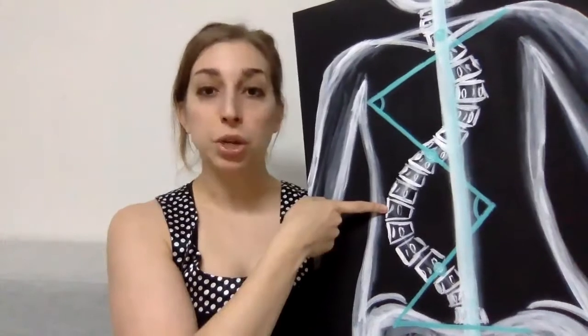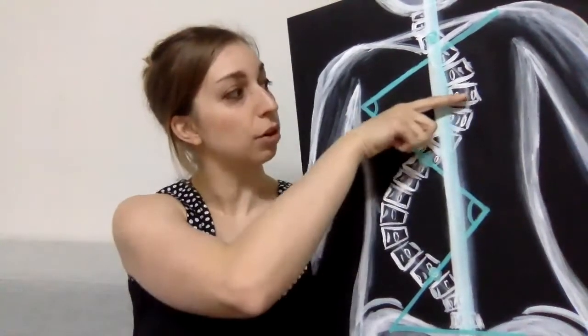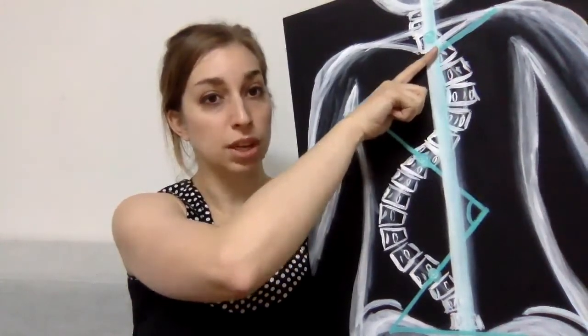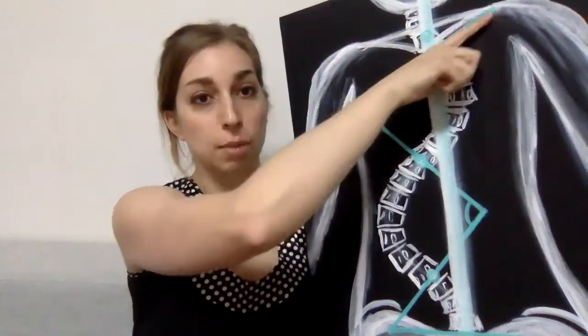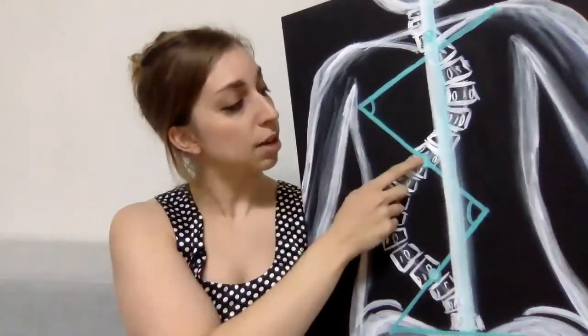When you are drawing your Cobb angle, it is a manual measurement. It's going to be a little bit different depending on who does it. What we're looking for is which vertebra is most tilted above and which vertebra is most tilted below the apex. So for this upper curve, it's more tilted here, more tilted here, a little less tilted there. So I'm going to draw my line across this tilted vertebra here. Then I'm going to do the same thing down here.